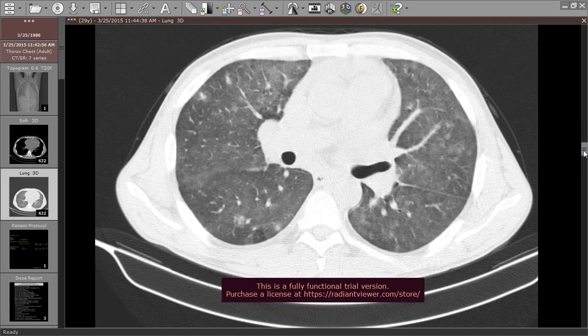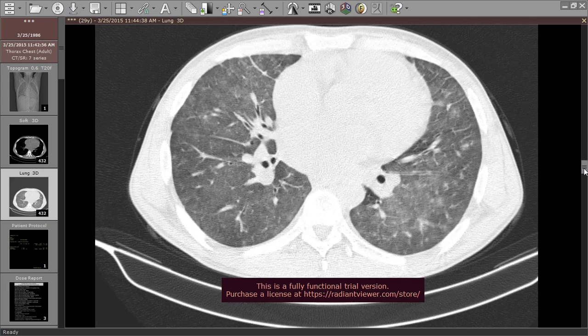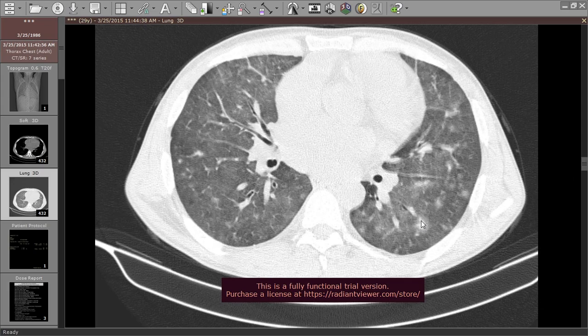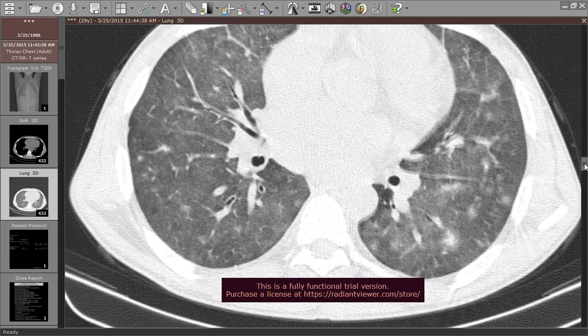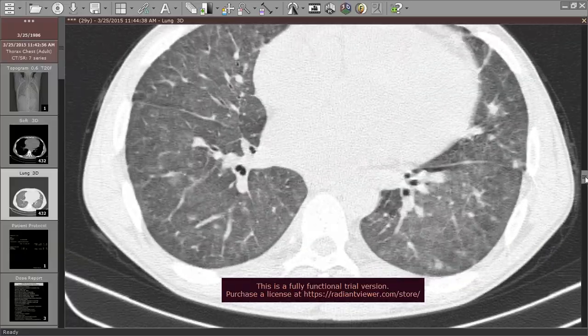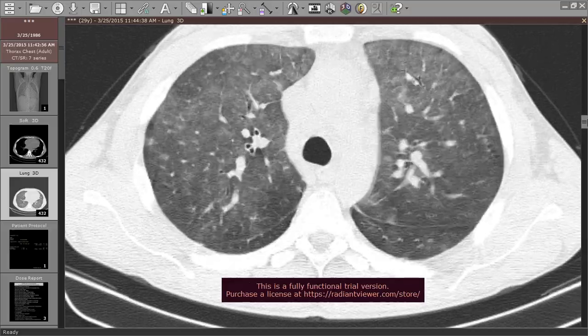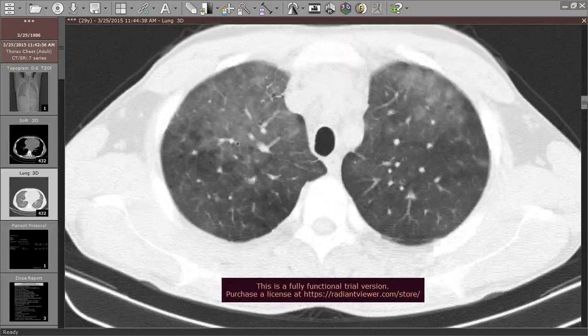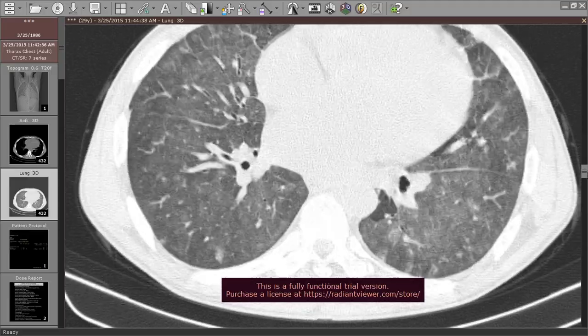There are several pulmonary nodules, as you see. These nodules contain a solid part and a peripheral ground glass part, which is called the peripheral ground glass halo. This halo sign is typical for an invasive pattern of fungal infection called invasive aspergillosis.